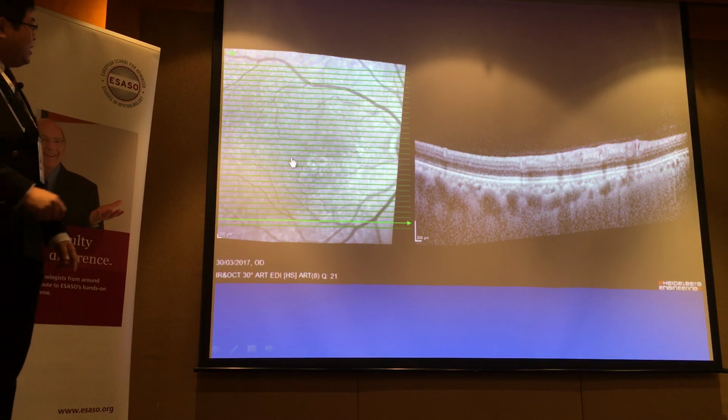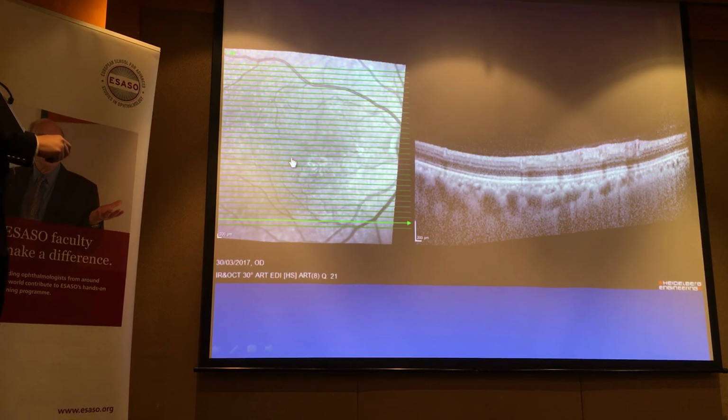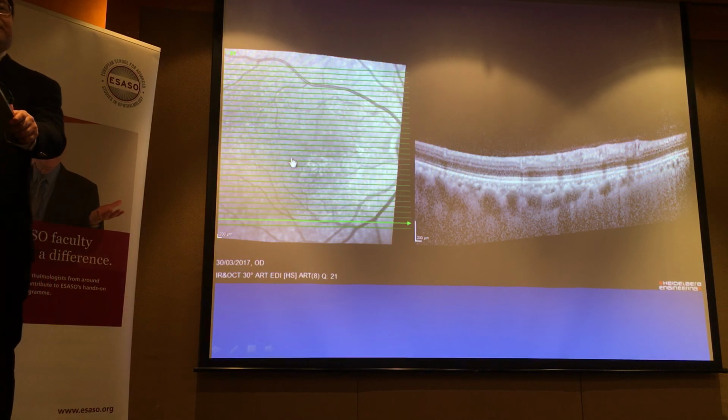Okay, so that's very important. Also, I mentioned to you, this one has 31 cuts. This is one of the settings on the Heidelberg. It is at least wide, but there are gaps. Of course, you do not expect a pre-retinal hemorrhage to exist only between two lines. That's true, but or even something like a tiny lesion. All right, I think some of you have asked about uveitis. Some very focal inflammatory lesions could be small enough to hide in between. Okay, so that's one thing.